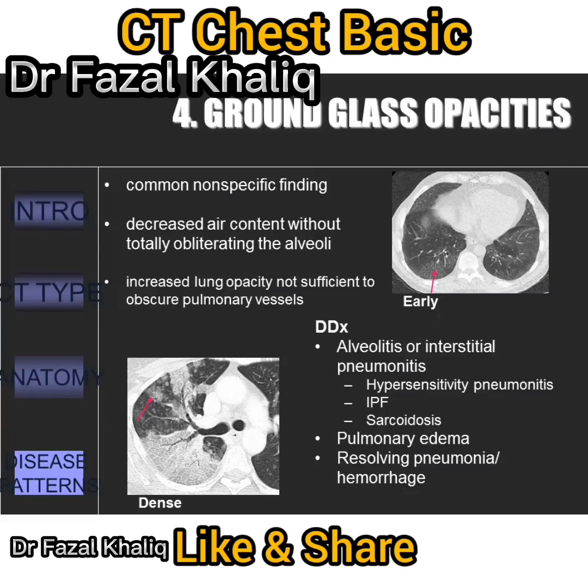Ground glass opacity is potentially reversible with appropriate therapy if the underlying disorder is treated early, because none of the changes in lung structure are permanent. Some active but potentially reversible processes that produce ground glass opacity include pulmonary edema, alveolar proteinosis, to name a few.